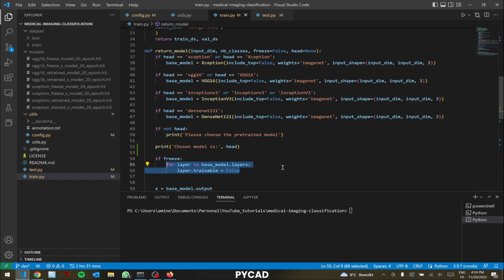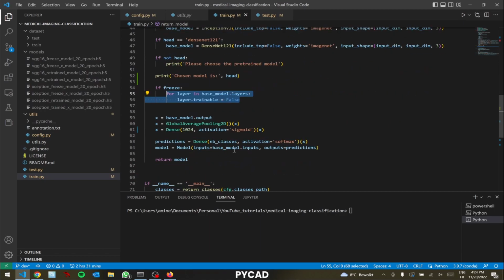So if, for example, one weight is like 0.01, or a matrix, you cannot touch it, you can leave it like that. The only thing that will be changed is the classification layer, or if you add, for example, these layers, only these parts will be trained, not this one, because this is the output of the pre-trained model, but these here will be retrained.